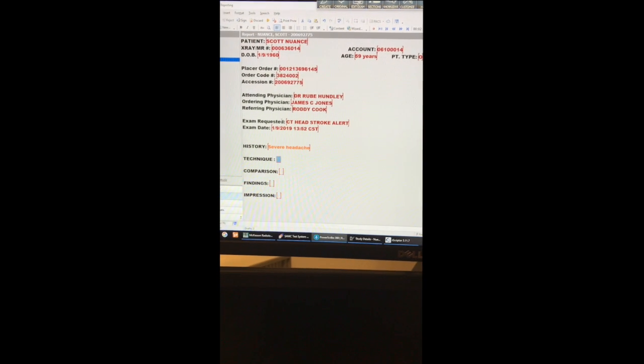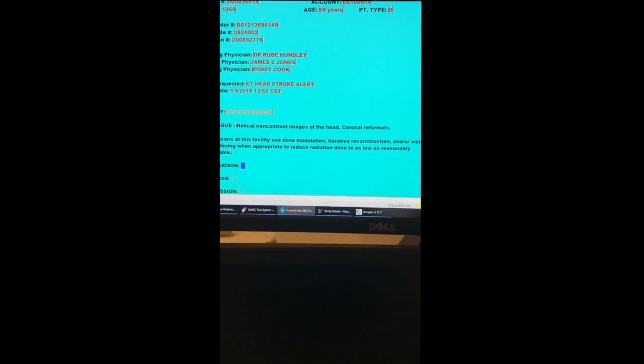Severe headache. When we get to the technique section, we have that big list of techniques in the technique folder, which I'm going to see if Gary can copy to everybody. CT head. Oh, scratch that. Click CT head. Okay, see it blows in the technique and the PQRI stuff. St. Elsewhere, January 2013. I'm mumbling, so it's not getting picked up.